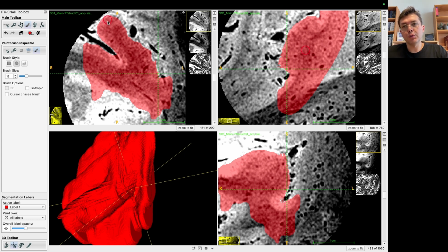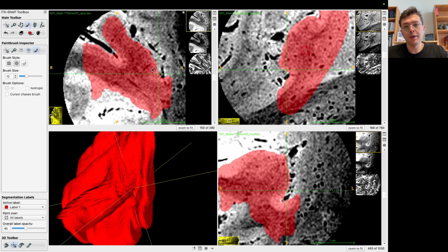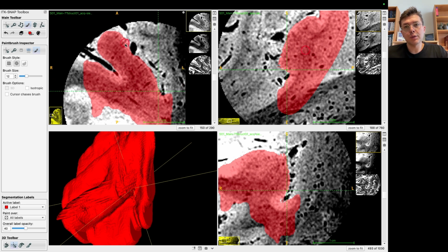Going through all these hoops to segment T1 weighted images and register them on these, which is between 0.7 to 0.35, they just don't work as well. I mean, you end up doing this work anyway. So my point is, why not just segment our region of interest directly and be done with it? That's my mindset.